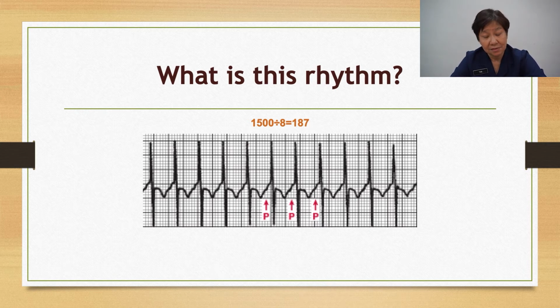Once again, just to remind you all, sinus tachy has a rate from 100 to 150. A narrow complex with a rate above 150, usually you will recognize as atrial tachy when you can see a small tiny upright P wave in front of your QRS.